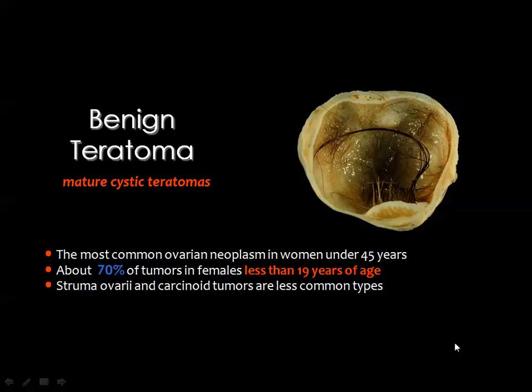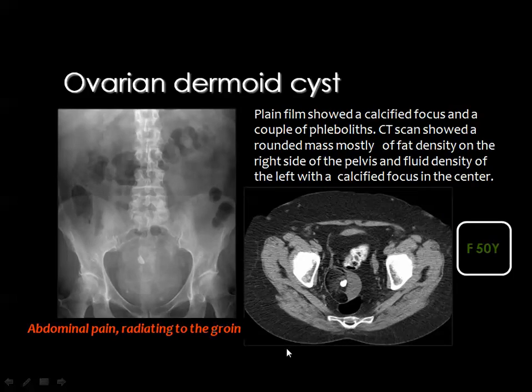Then this is struma ovarii, one of the teratomas that contains purely thyroid tissue, as I will mention later on.